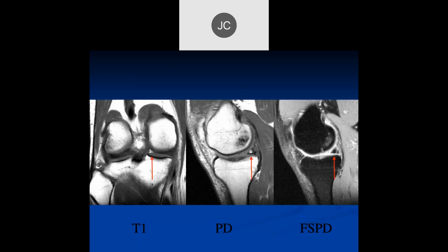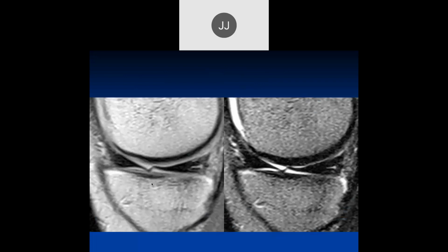So how do you get a meniscal ossicle? For a long time we thought these were congenital, but the problem is you look for them in kids and you don't see them. John, were you going to say something? No, I wanted to go back to the flounce.